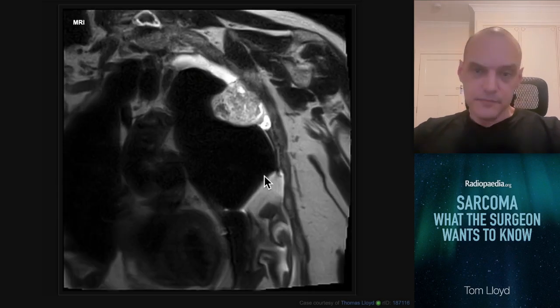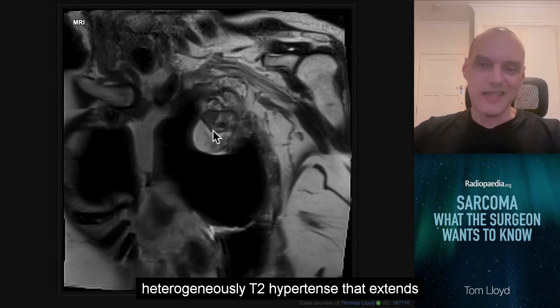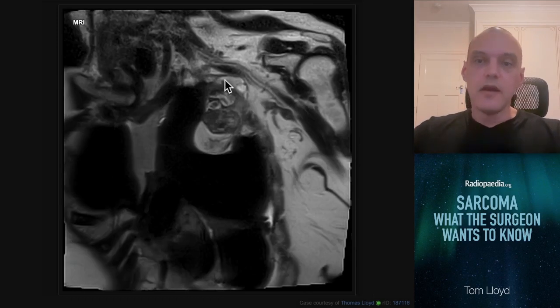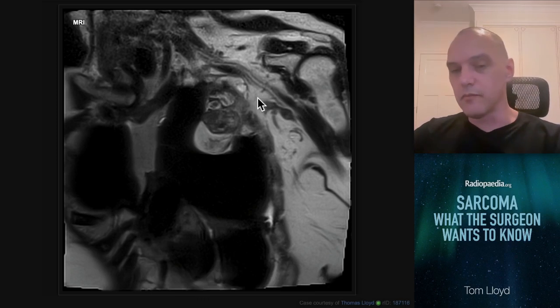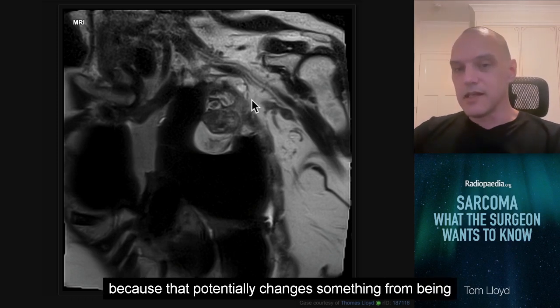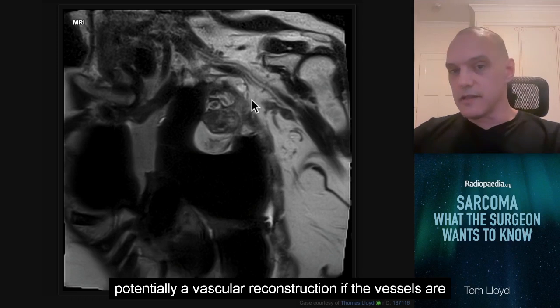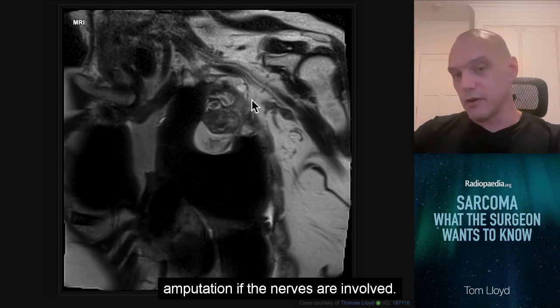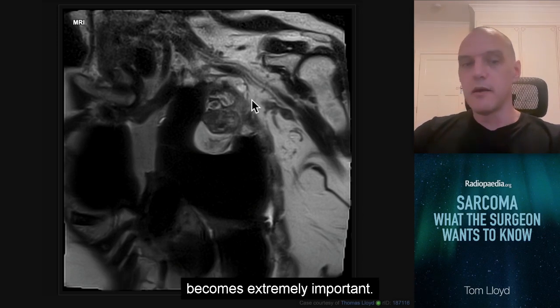But leaving that aside, what we can see is there's a lesion here, heterogeneously T2 hyperintense, that extends through the chest wall, and importantly, and you can see it just here, it contacts the axillary neurovascular bundle. So that becomes very important because that potentially changes something from being a chest wall excision to potentially a vascular reconstruction if the vessels are involved, to potentially a forequarter amputation if the nerves are involved. So being precise about where it is, what it's touching, becomes extremely important.